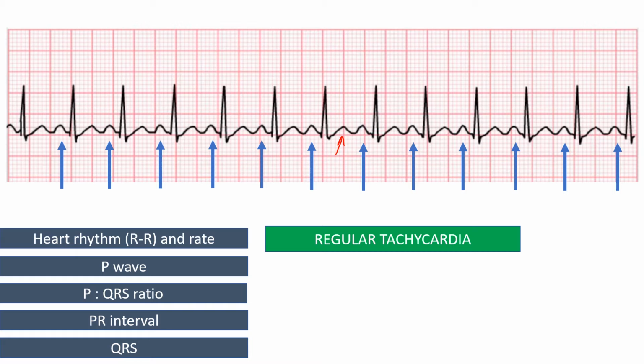The T wave is asymmetrical. It has a delayed onset and rapid offset, while the P wave is symmetrical and its onset is like its offset, unlike the T wave. So for the P wave also, we look for the amplitude and width. Its amplitude and width should not exceed 2.5 small squares in lead 2.